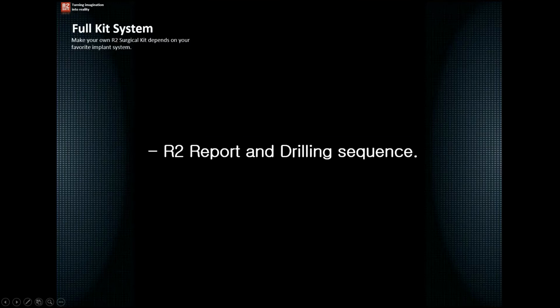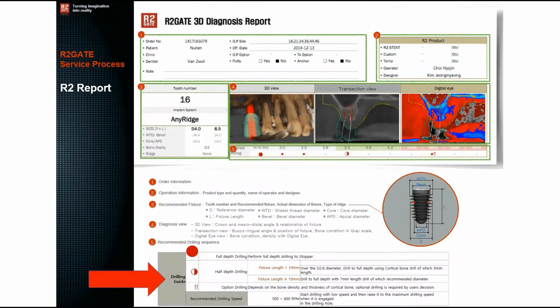Now let's talk about the R2Gate report and drilling sequence. With each R2Gate case you do with your R2Gate center, they should send you an R2Gate 3D diagnostic report. And now I'll talk to you about how we can read and use the R2 report.